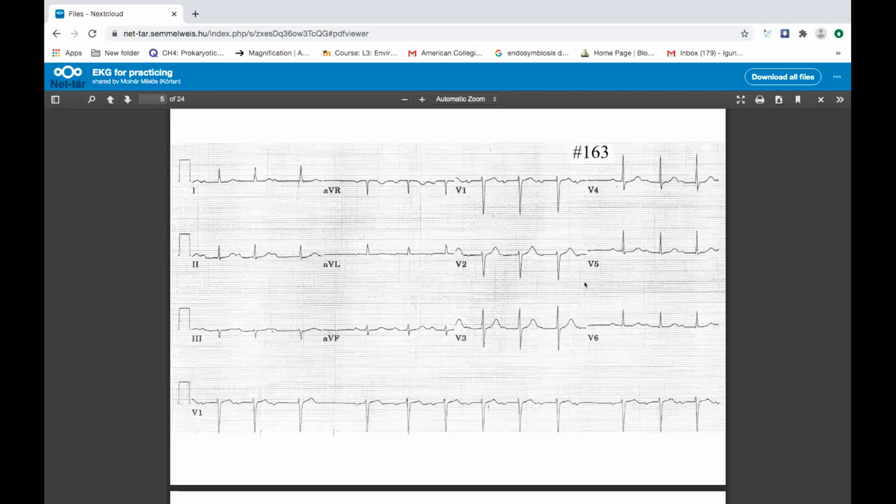Oh, wow, that's a nice one. So far, so good. I think I did it. Yes, you did it.